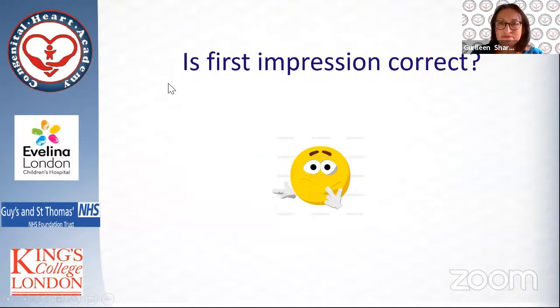And this is the last example I'm going to show you. Is your first impression always correct? Are you paying enough attention, or are you doing something in a hurry and jumping to conclusions because you think it's something based on what you've quickly looked at?